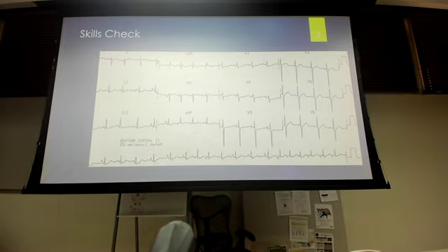Let's do a couple of skills checks from last time we met. Last time we met, we talked about tachyarrhythmias. So these are going to be from our tachyarrhythmias. Okay, ma'am, let's do this.